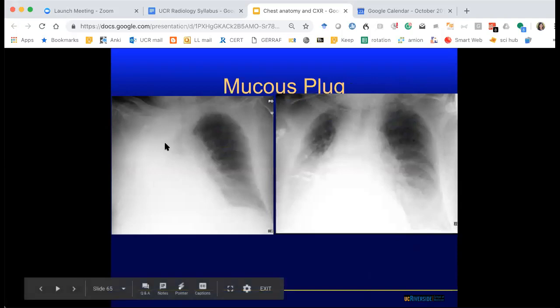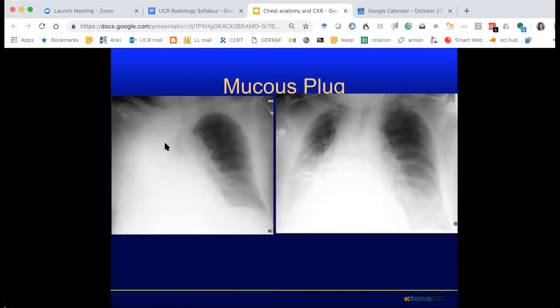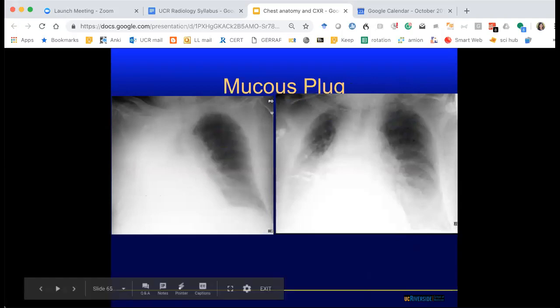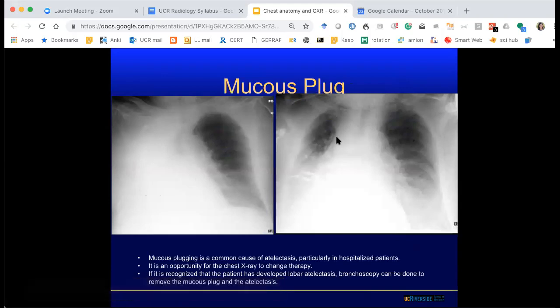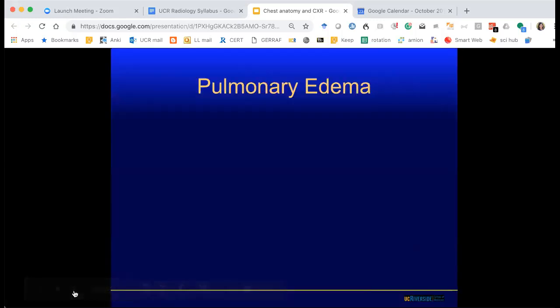If, in contrast, you had pleural effusion, that's actually a mass effect. So if this was due to pleural effusion, the heart would actually get pushed to the left side, and you would have maintained normal lung volume on the left. So then after they sucked out the mucus plug with an endobronchial scope, or aggressive respiratory therapy, they were able to reestablish a patent airway on the right.